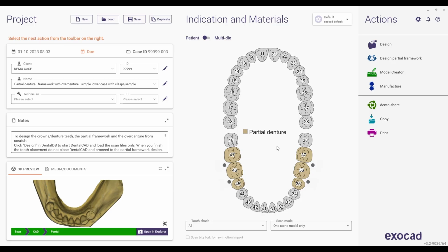This video is meant for you if you are a dental student or a dentist or a laboratory technician who is just looking to get into partial design. Partials happen to be one of my most favorite things to work on, and it does need a little bit of background knowledge on what you're doing, but then once you do that, you're good to go. So let's just jump right in.